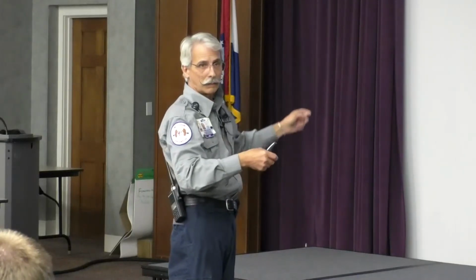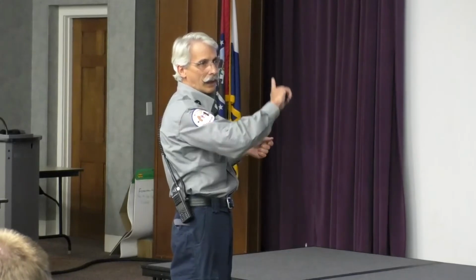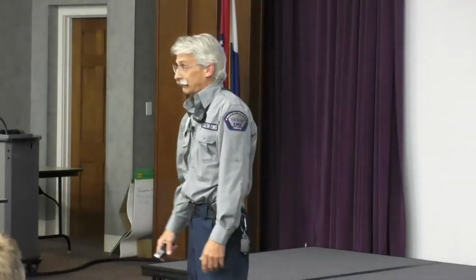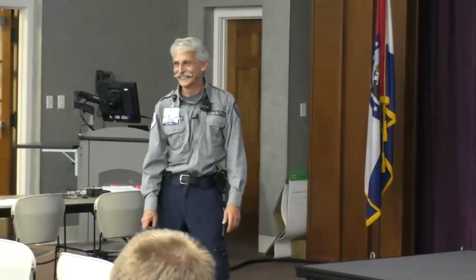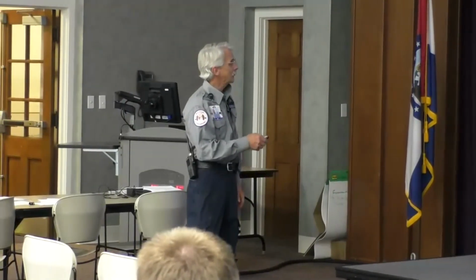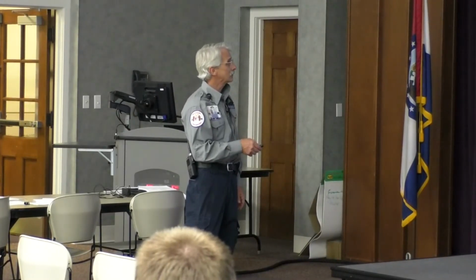If instead it went up, I would push my blinker up and it would be a right bundle branch block. I don't know how much more simple you can get than that. Clear as mud, okay? Can there be rabbit ears? Absolutely.